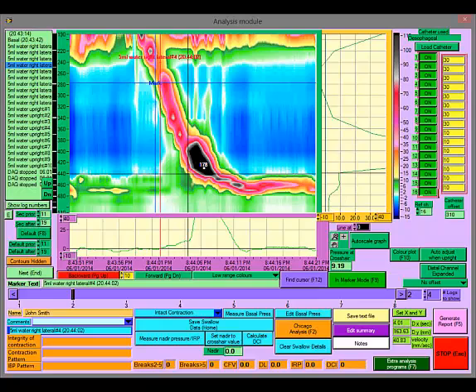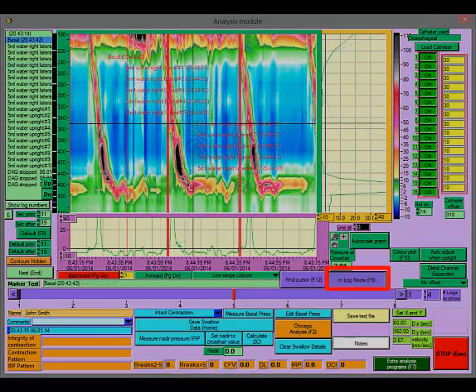The first step in esophageal manometry analysis is to measure the basal sphincter pressure. To do this, you will need to have the appropriate data displayed in the colour plot. Go to the marker at which you began the basal pressure period and then click on the In Marker Mode button to change to Log Mode.